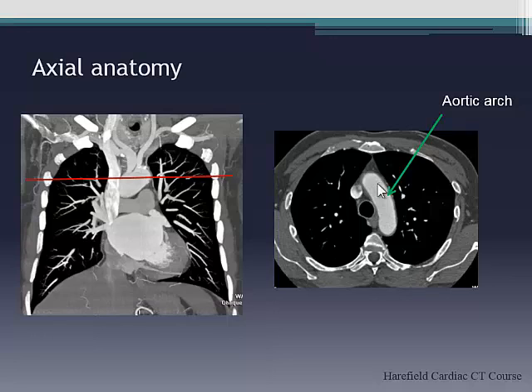And the way to distinguish those two on imaging is you can follow it up and down because you've got a volume of data. If you see an absent pulmonary vein and you see the pulmonary vein draining into the brachiocephalic, and the brachiocephalic coming across, then it's anomalous venous drainage. Normally two brachiocephalics form the SVC, right? If you've got a left-sided SVC, usually the brachiocephalics stay separate, so you'll see them go down. And the other clue, as you know from echo, is to look for a dilated coronary sinus, because a left-sided SVC drains via the coronary sinus.